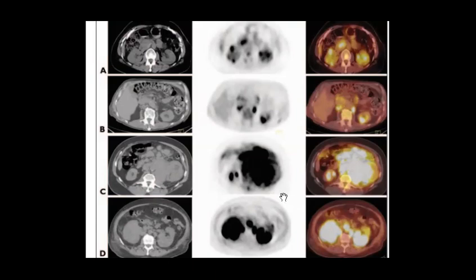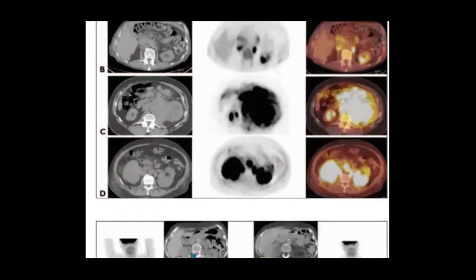What happened here? It takes almost the left kidney. Yes, it is invading the left kidney, and again there is some retroperitoneal lymphadenopathy. Perfect. Finally, this one is taking both kidneys with diffuse infiltration and retroperitoneal lymphadenopathy.